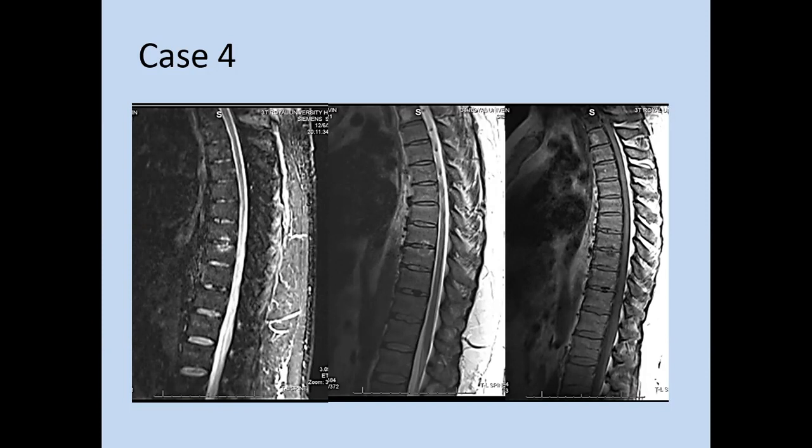Sagittal T2 fat saturated sequences of the dorsal lumbar spine.